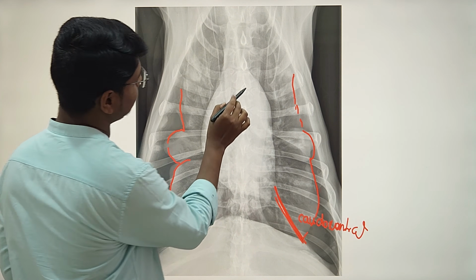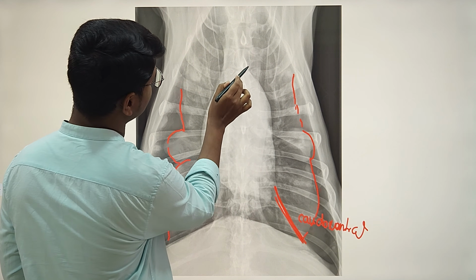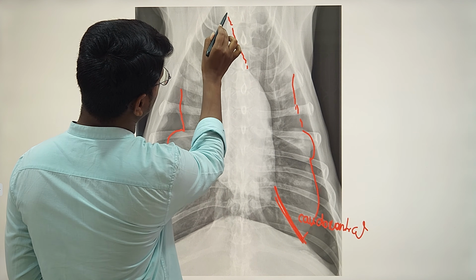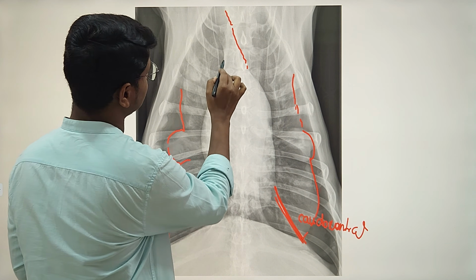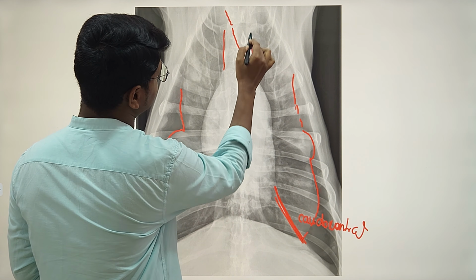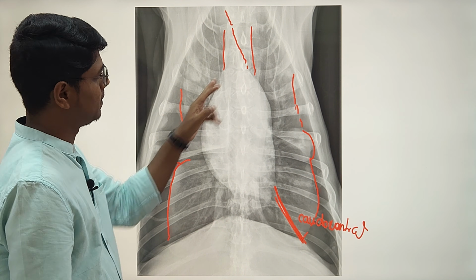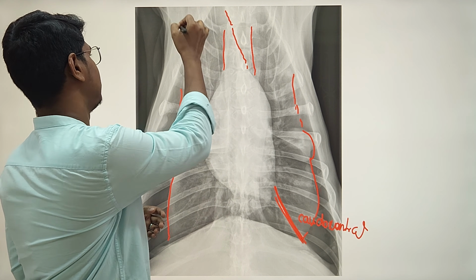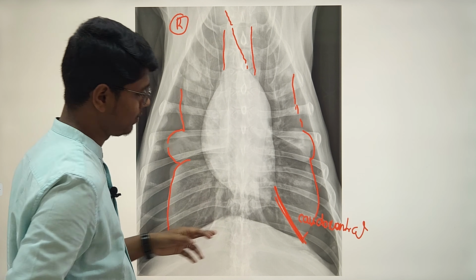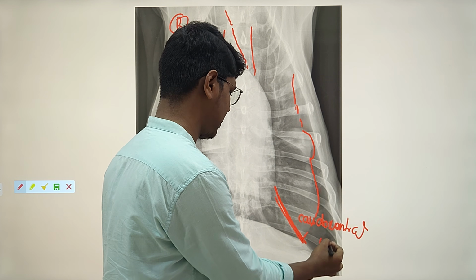Now, if you see the cranioventral, you can see this cranioventral, slightly deflected from the mediastinum. The mediastinum runs here. This is the mediastinum. The deflection slightly runs towards this one, the right side, while the caudoventral deflection runs towards the left-hand side.